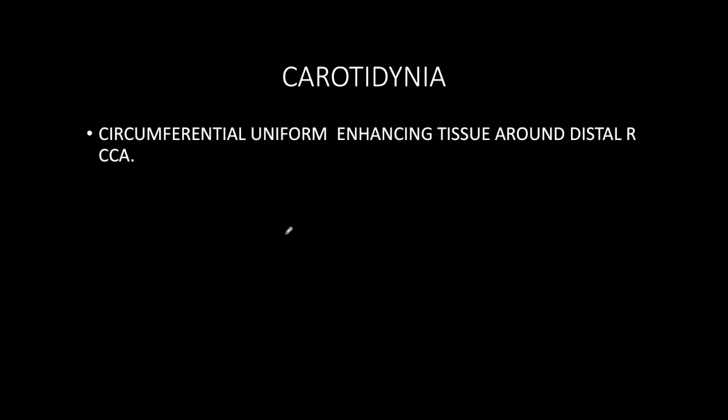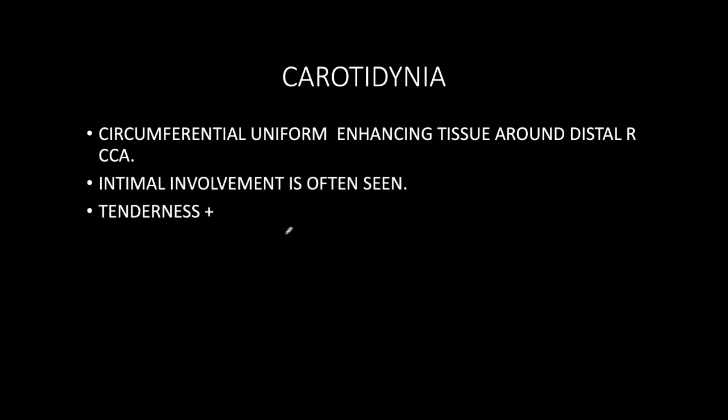It's circumferential uniform enhancing tissue. In this case, it was around the distal CCA. Intimal involvement is often seen, and that's enhancing. The patient has tenderness. Treatment is steroids. You give steroids for 10 days or 2 weeks. The patient actually gets cured. It resolves.